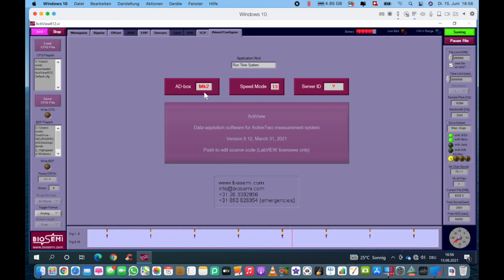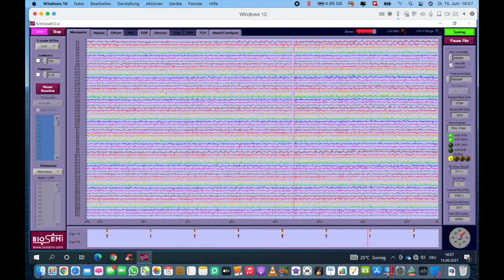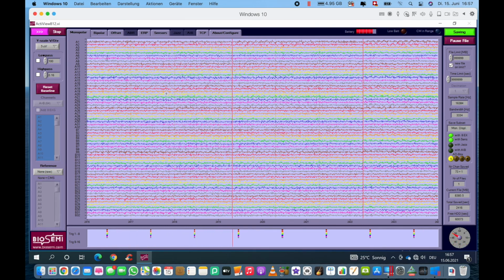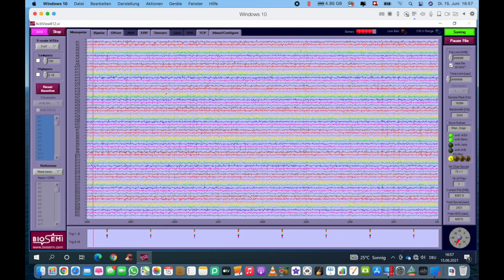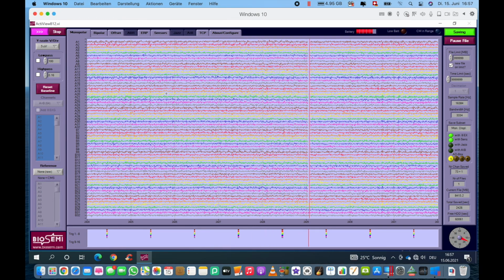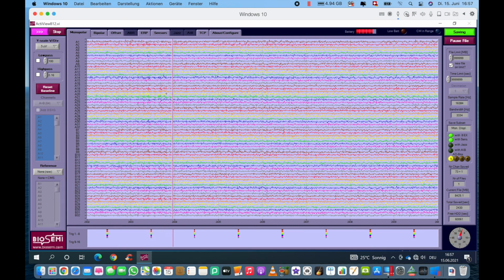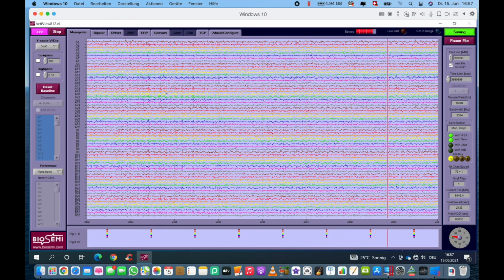This is obviously my Mark II 64 channel EEG system from BioSemi. So I think this finalizes our last snapshot on what we've done. Again, we can run the Windows version nicely through Parallels on a MacBook Air, MacBook Pro, MacBook 15-inch, even an older one, with Big Sur. This is an M1 processor.